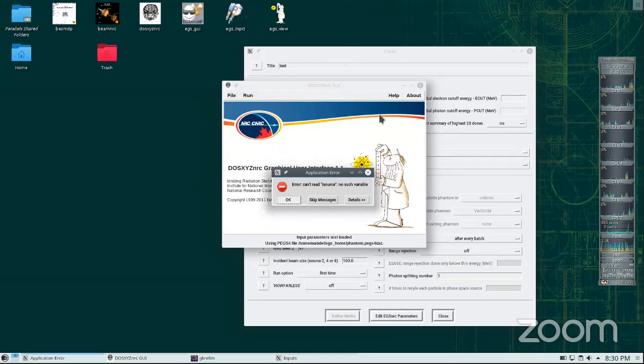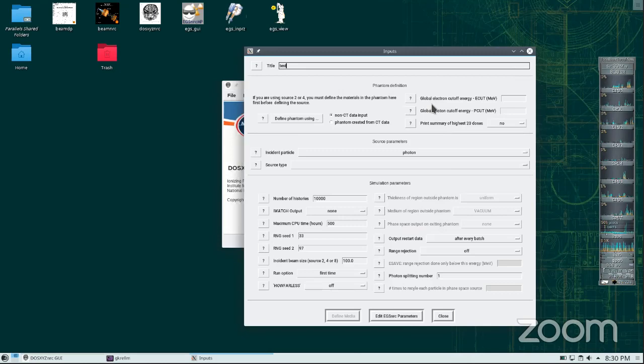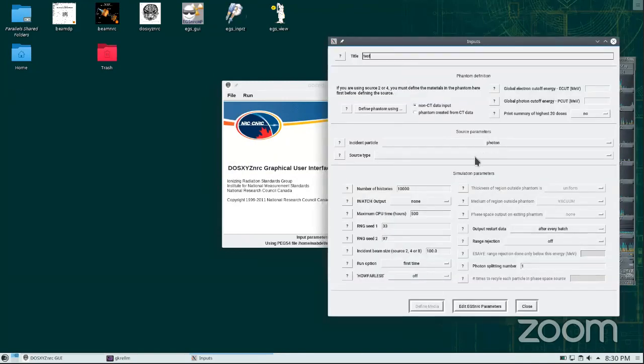Anyway, the part that you really need to spend time on and understand a lot is the geometry. Those RZ, I hope we covered it in the presentation. It was clear for everyone. Now, here, we're going to start with non-CT data. Dr. Omid, it's complaining because of the source type. You did not select it. Under the photon, there is source type. Oh, okay, this here. Yes, that's fine.